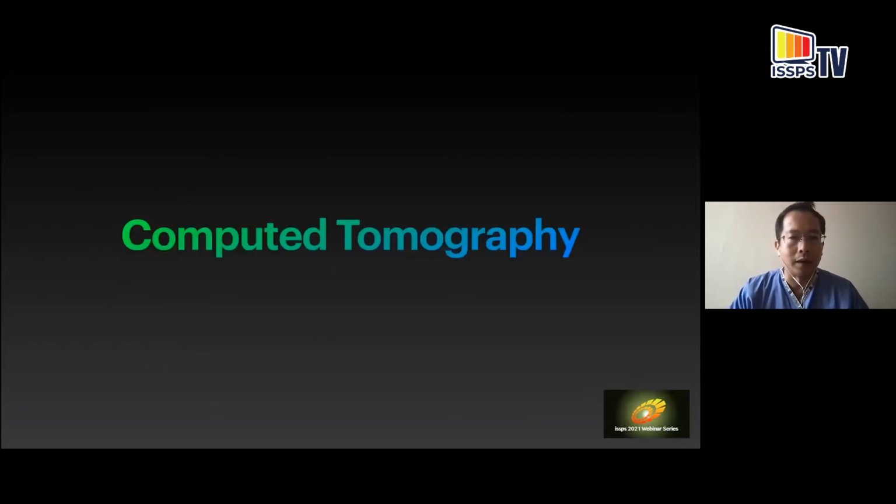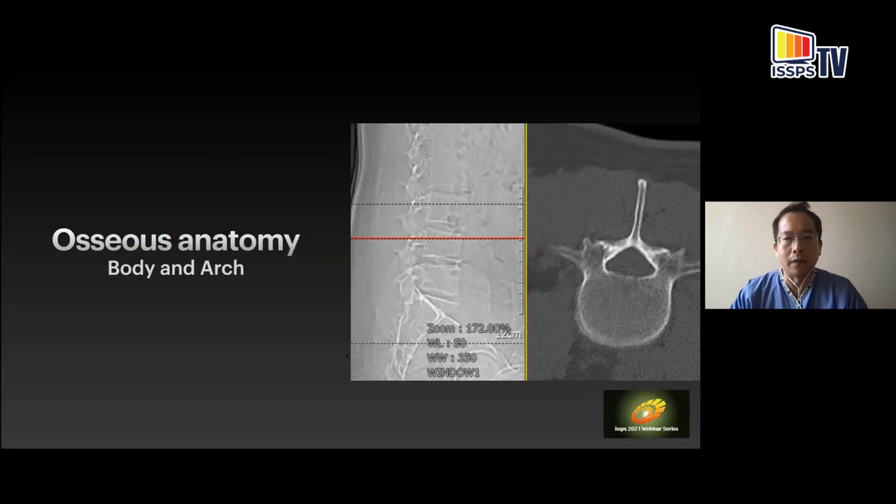subdural space. So firstly, with CT scan, you can get really thin cuts, sub-millimeter, usually 0.6 millimeters, and then you can reconstruct that into sagittal and coronal images. But what's really used in practice are the axial images. And so I'm going to show you some real-life images here.